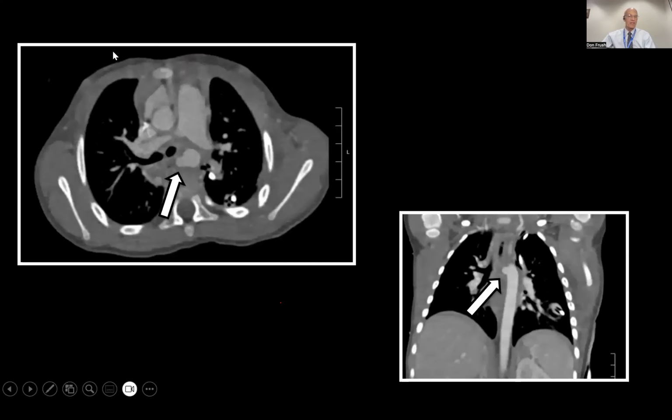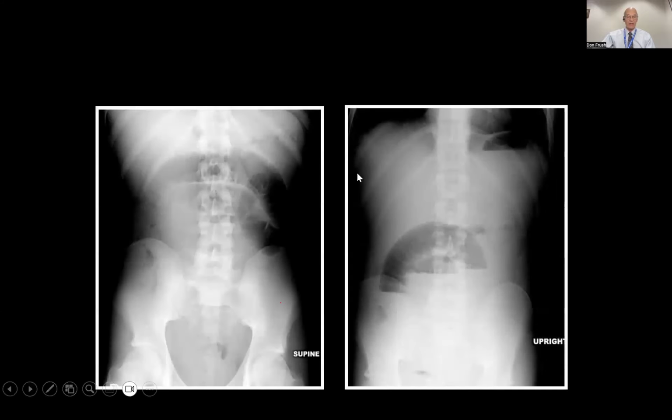And what happened, this is a CT examination, contrast enhanced axial image. This is the aorta right here, and you shouldn't have this little excrescence off the aorta. This was a pseudoaneurysm from a button battery there. And button batteries can be life-threatening and can have a substantial mortality here. So you need to recognize what these look like and give them emergent attention.